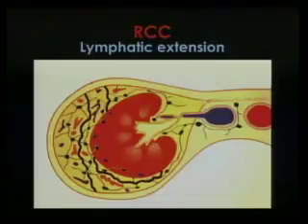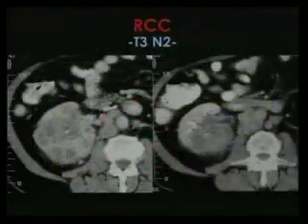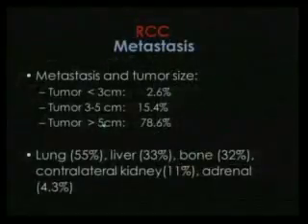These lymph nodes, when the tumor affects the kidney, can disseminate the process into the retroperitoneal perivascular nodes: intercaval aortic, retroaortic, retrocaval, or precaval and preaortic, depending on where the tumor is located. Example: large tumor, right kidney, a lot of intercaval aortic lymphadenopathy with necrotic changes.